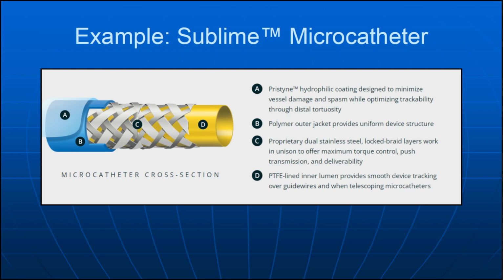The second and third layers are dual stainless steel braid layers. The company did not specify the wire size of the braid. The matrix material, or the material that fills the braid layer, is the outer polymer jacket material, which is not specified. The fourth layer is the outer polymer jacket material.